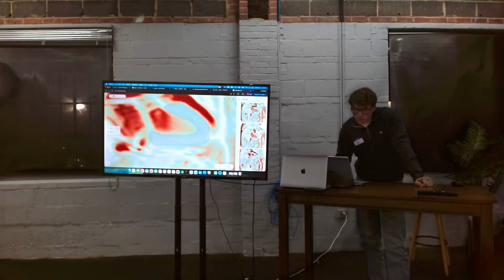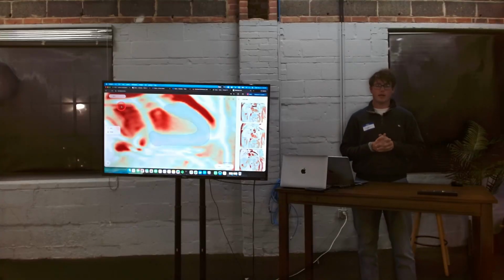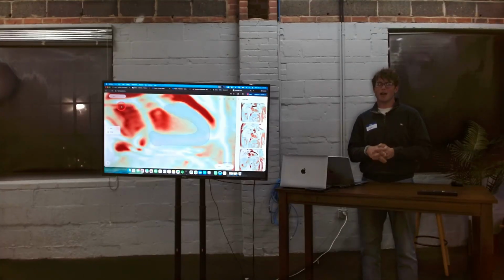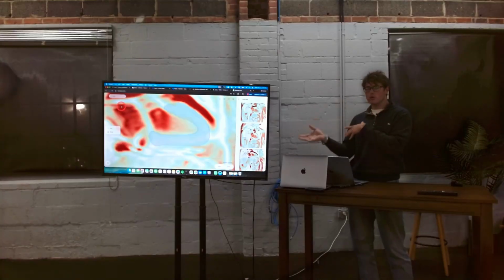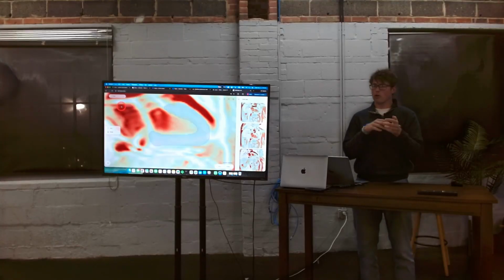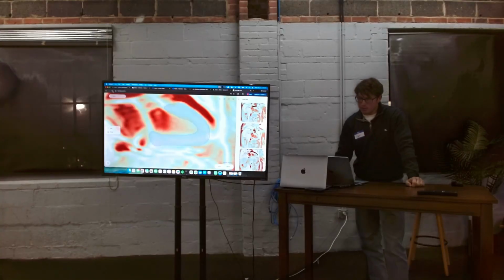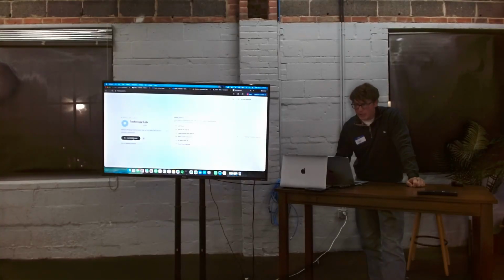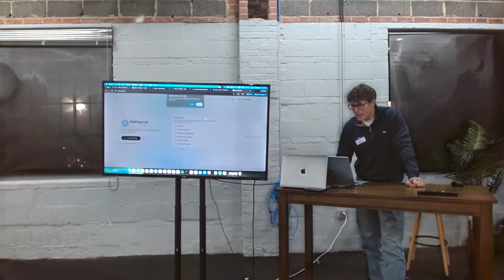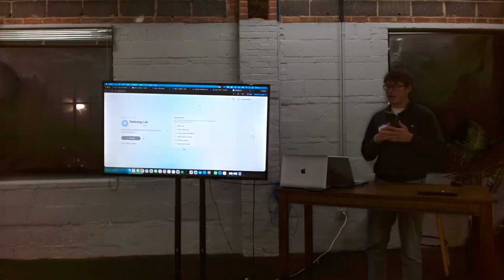One other data set that I wanted to show was, so yeah, the objective is to help people label data so they can build training data to train other AI models. Then they can hook those AI models into the same platform, and it will be geared and fine-tuned to their heart modalities or their brain MRI, whatever their imaging is. So reloading this, I'll open a brain MRI data set, which typically has a lot more planes and a little bit higher resolution.